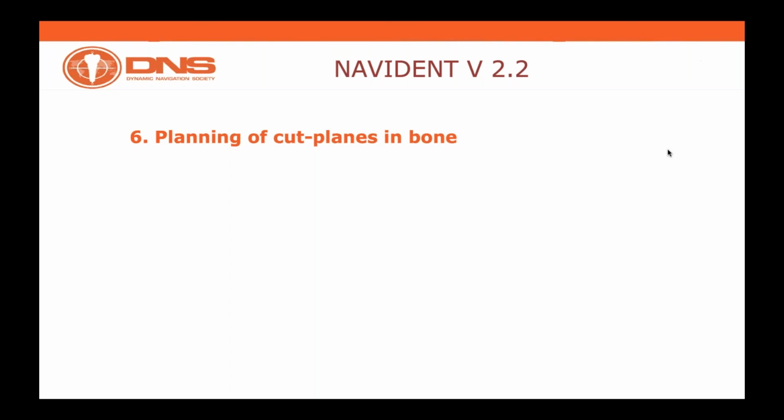From the explanation I gave, we've seen the opportunity to match the bite with the arch, but nothing forbids eventually matching some markers available on the STL files together, while, for example, we do not have teeth, or while we want to add layers of complexity, one on top of the other.